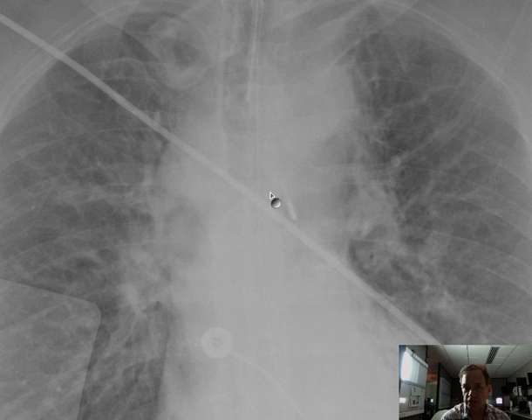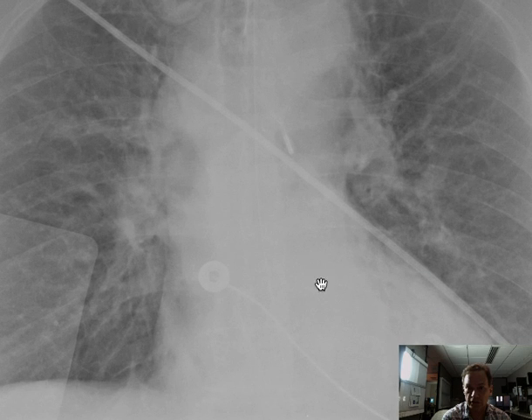So to me, that suggests that the patient probably has right heart failure, because this is systemic return, which needs to go to the right atrium and right ventricle. If the patient has right heart failure, it means the right heart can't pump out well enough, so there's back pressure from the right ventricle to the right atrium, and then in turn from the right atrium it will affect the SVC and IVC and delay the entry of blood from the SVC and IVC into the right atrium.